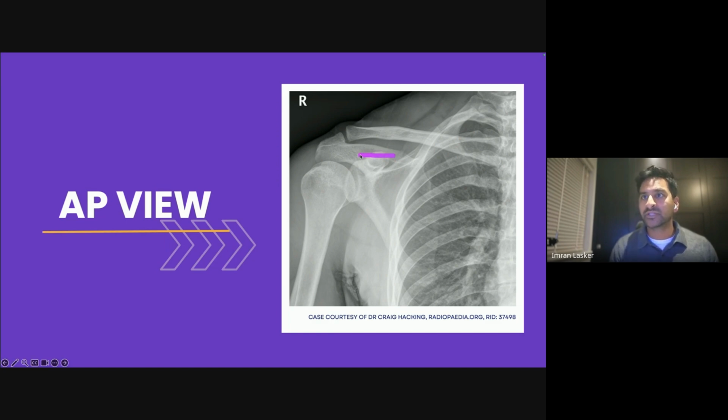So these are where your tendon would go, right? Tendon would go all the way around like so. Another one goes around there. Another one goes around the back and around the back of the scapula. And that will make more sense as we go through the rest of the study, rest of the cases.